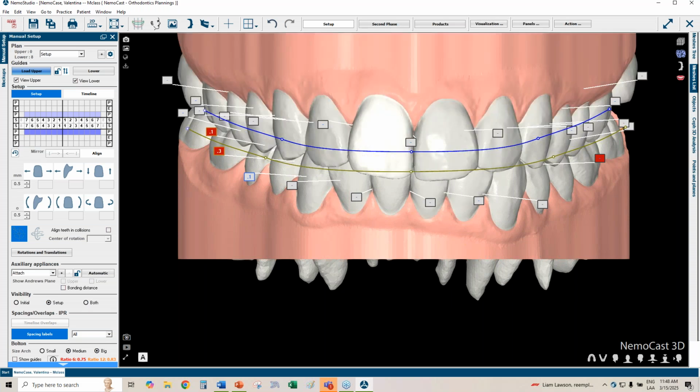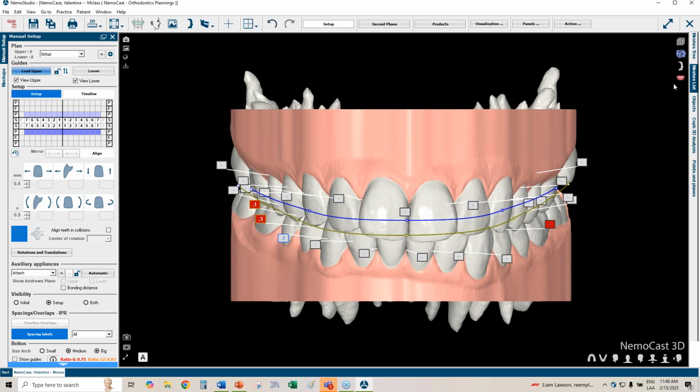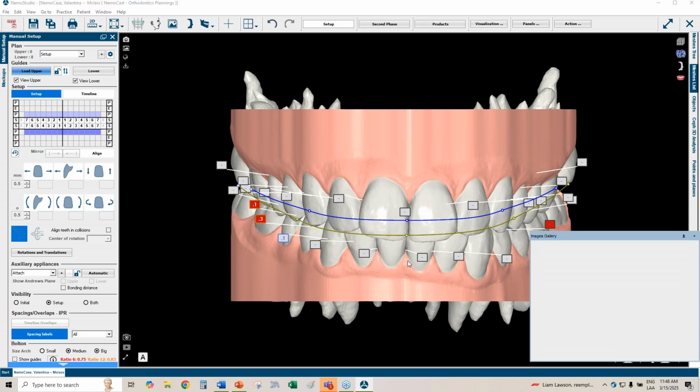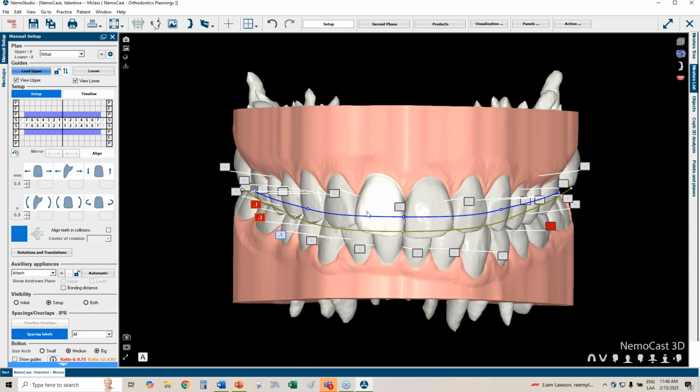This is going to give us a good height for our incisors, a good occlusal plane right here, that we can actually change the guide a little bit, and this guide will also help to guide the smile arch. As you can see right here, if I were to follow it, it's consonant to the lower lip. So this is all the required tools in the diagnostic of the case that we need.